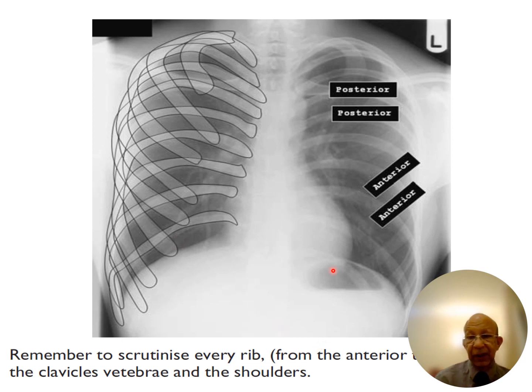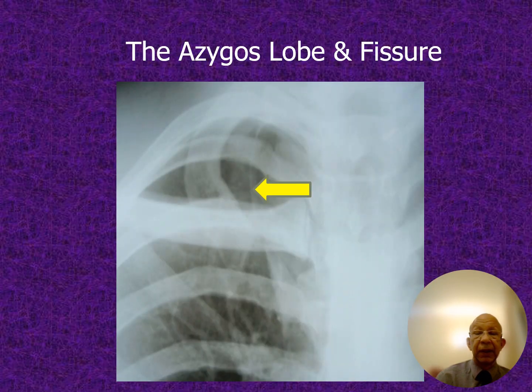and therefore you cannot see them. And this is the gastric air bubble with the fluid level there in the stomach. Be aware, if you see this behind the heart, then you have a hiatus hernia. It's also important to be aware that there are something called azygous lobes and fissures, and this is actually a rudimentary embryonic origin, old vessels there.